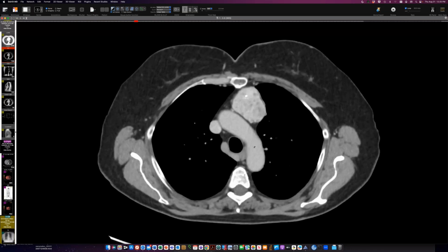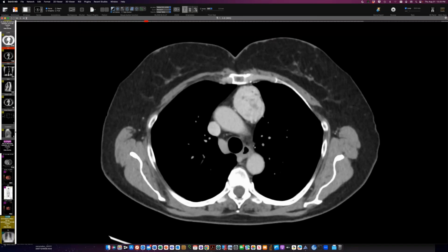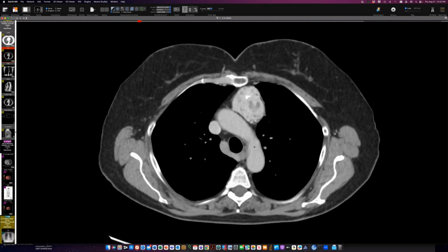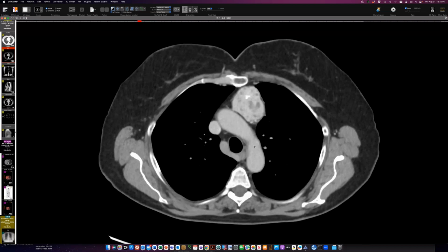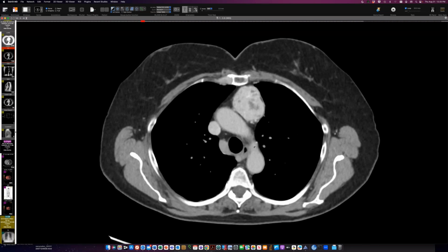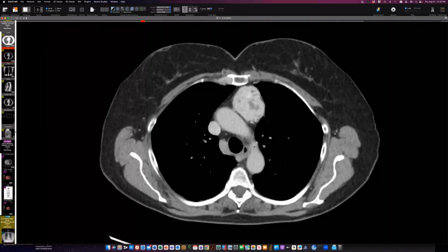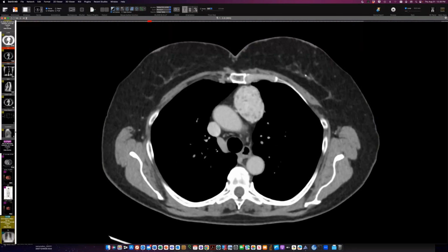I mean, the one I think about, paraganglioma is unicentric. What about Castleman? Unicentric Castleman can be very enhancing. Calcification, I'm not sure about. The ones that I've seen that are unicentric Castleman typically don't have areas of low attenuation within. They are just homogeneously very attenuating. Okay, a very unusual location for a neural tumor of some type.